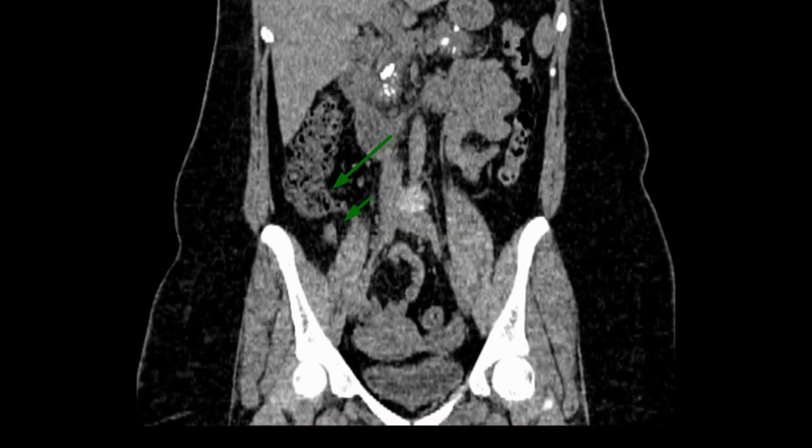So now we'll see some cases of colon cancer, and that is just to highlight the importance of viewing the scans on the console so that you can identify the thickening of bowel. Also, we will see the role of contrast in this imaging, and we will appreciate the need of viewing these scans very specifically with some key points in mind if we want to plan surgery or we want to completely report these scans if we are radiologists.